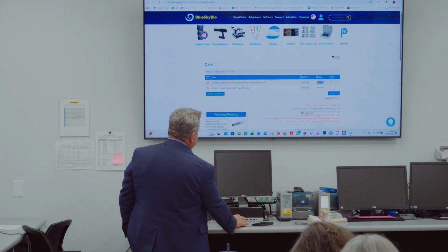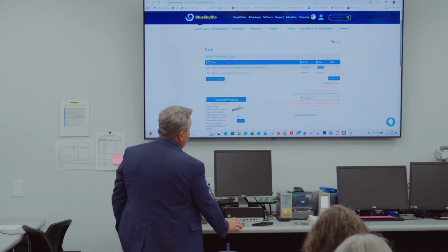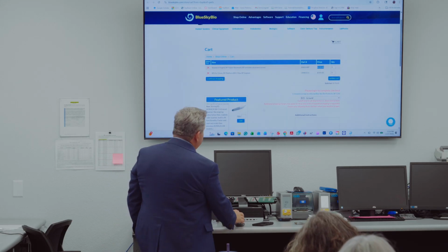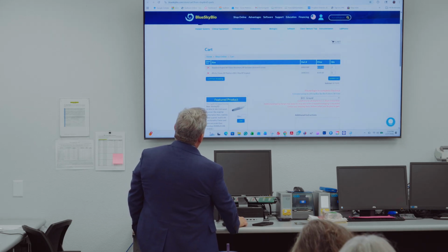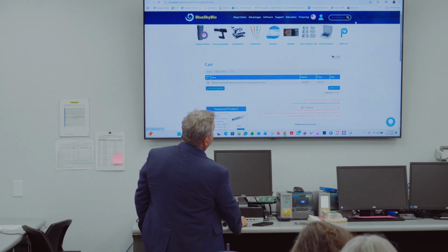I'll show you how to get that too, and you have to pay the shipping. If you buy an abutment, you get the crown for free. And I'll show you that when we go to the Blue Sky Bio, the Lab Pronto website. But if you don't need these things, you don't need them. But we're not going to worry about it anyway because we're not buying anything today.